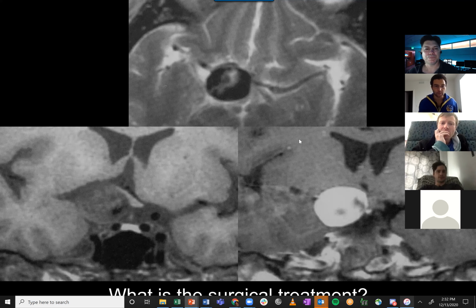All right. On the left, we have an axial, I think T1 post contrast of the orbits. The nose is bright. The cavernous sinus is bright. And then we have the coronal through the orbits, T1 post contrast. What I'm noticing, just comparing left to right.